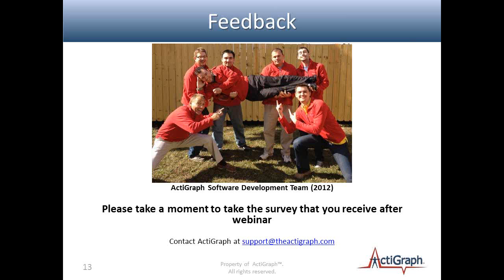So that's kind of why we mainly focus today on the ActiSleep devices. Also, the auto scoring is only available for ActiSleep devices. You can still do the standard sleep scoring with the GT device. We just wanted to make sure we showed some of those features.